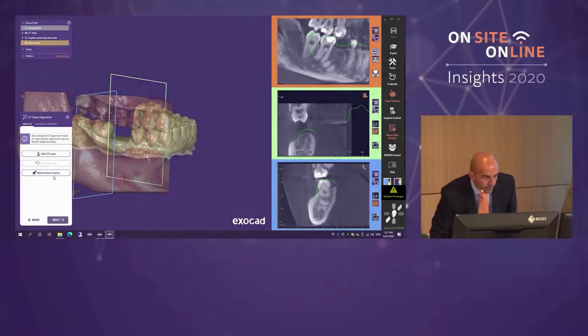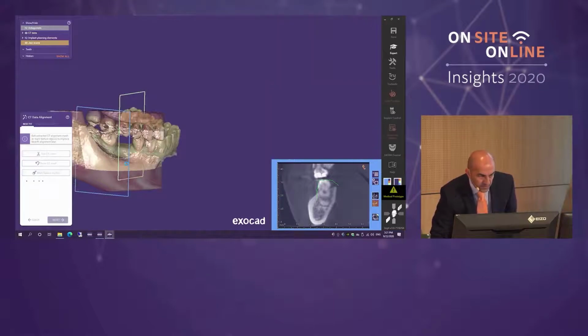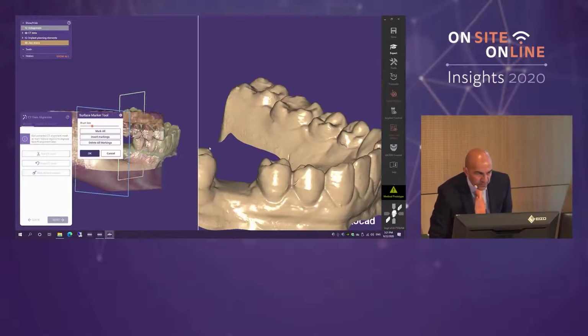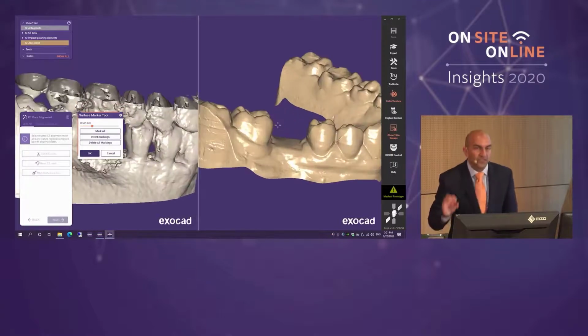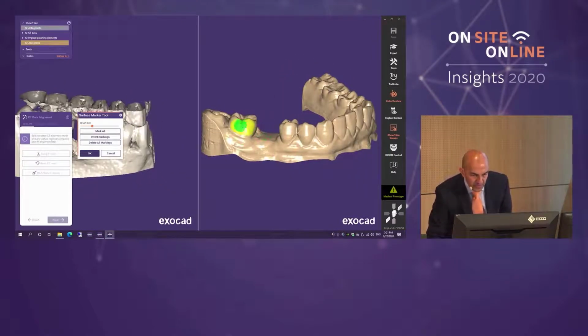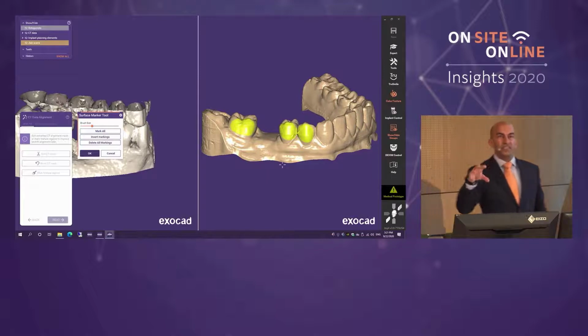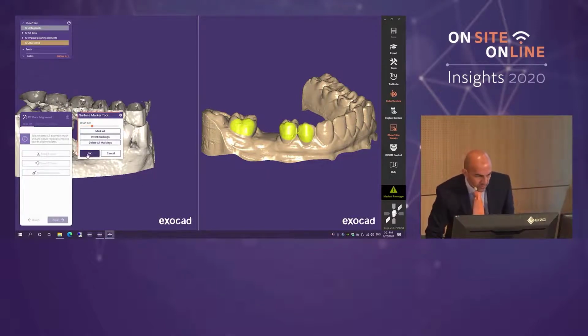Okay. Now we're going to make this even more accurate. This is something that the developers have come up with, a beautiful feature. It's actually called mark feature regions, okay? So rather than just points that correlate, I can use this and color in elements of the teeth and say, well, you know what? These are really important points. I picked these particular points because these are either side of my proposed implant restoration.